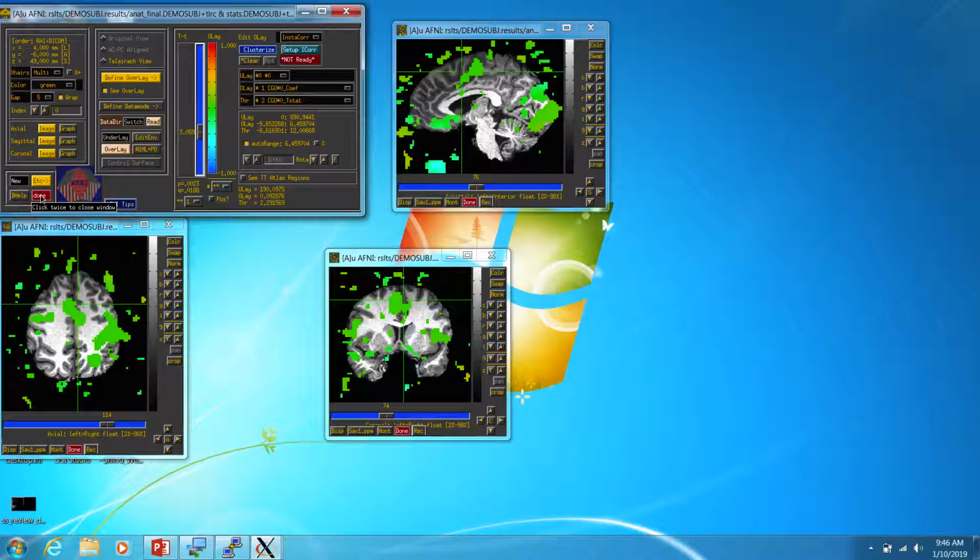So this is not really an activation map. This is a probability that the activation in that area is different, or was related to whatever your regression is. Yes, that's a good clarification, a better way to help understand it. Okay, so I'm not going to go too much into the analysis, but that's the start.